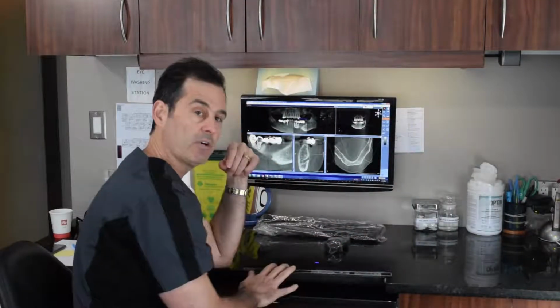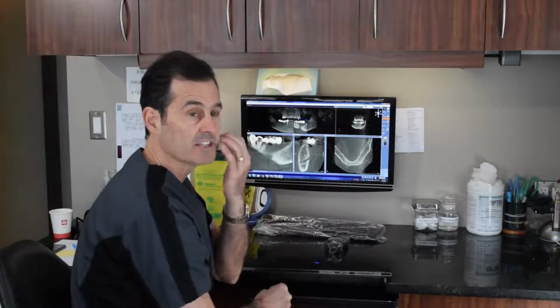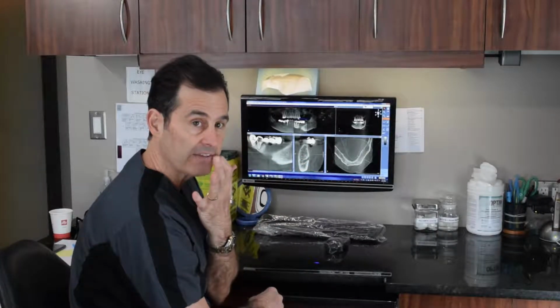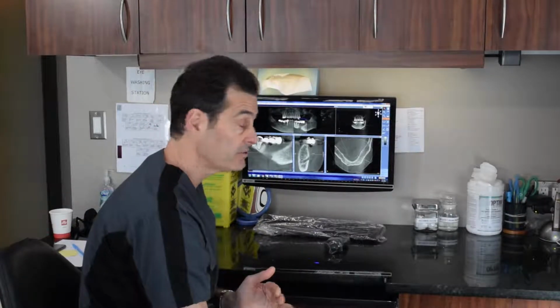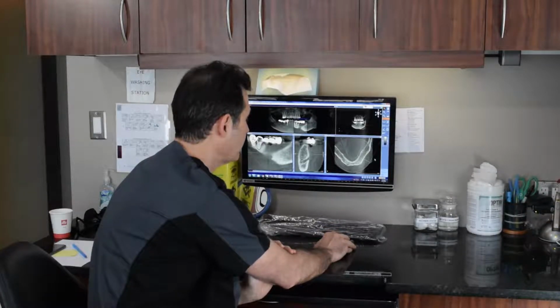This is the nerve that when we're doing dentistry on the lower teeth, that's the one that we numb up. If we were to damage this nerve in surgery, you would be left with a permanent numbing of that lower lip. So obviously that is a very bad thing that we don't want to do. So what we're going to do is mark out where the nerve is before I start planning out all my implants.